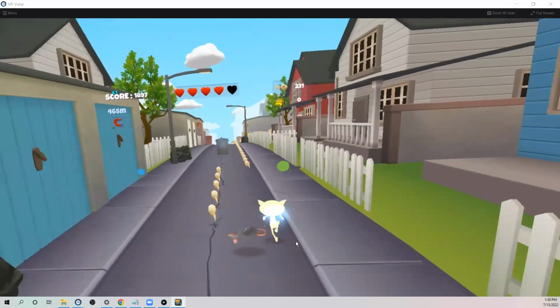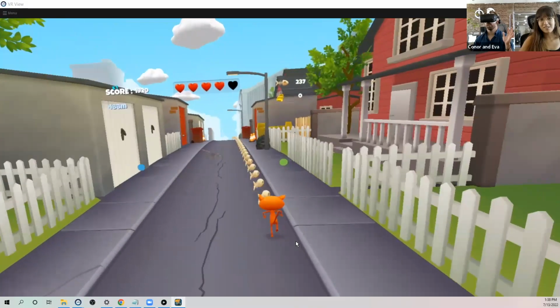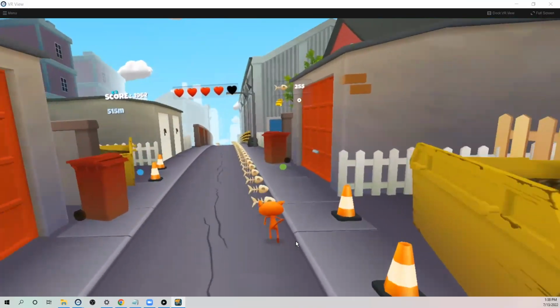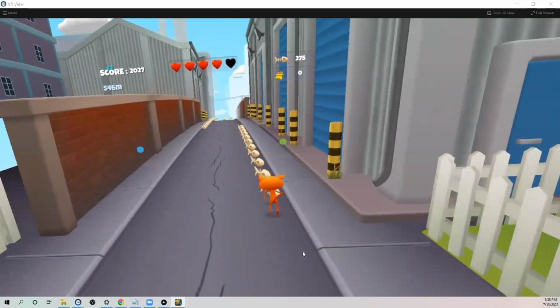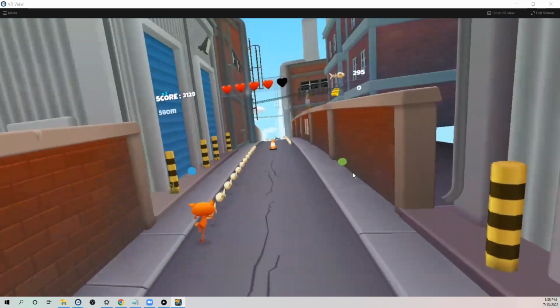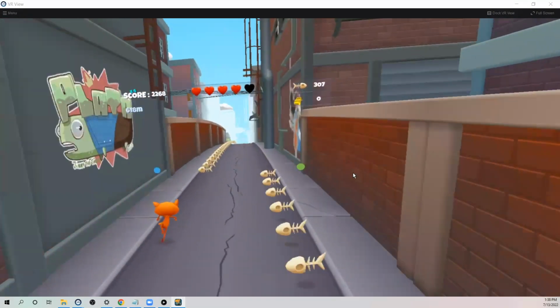Eva, maybe you could talk about. That wasn't me. The rats are pesky. What were you saying, Joe? Without pulling up the GUI again, or maybe if it's easy to switch back and forth, talking about some of the filtering, like how to change how hard you have to do the muscle movement to trigger the threshold, the different filters and threshold settings that we have built into this.